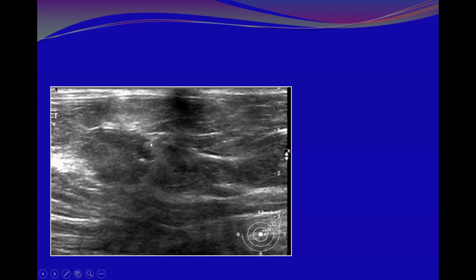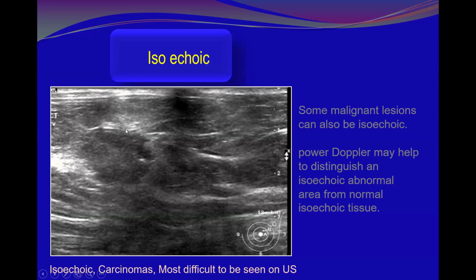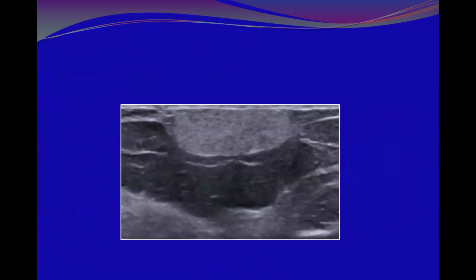This is the echogenic ring, making contrast, separating the margins from the surrounding tissue, and the cut-off signs, you see, all due to these indirect signs and the surrounding reaction that make this cancer appreciated in ultrasound. So there is a good number of malignancies that appear as isoechoic lesions.